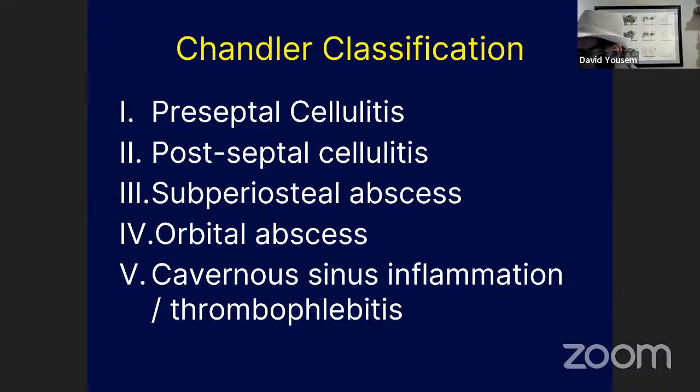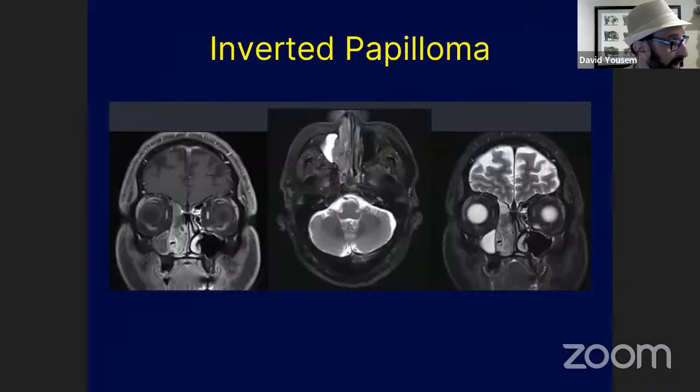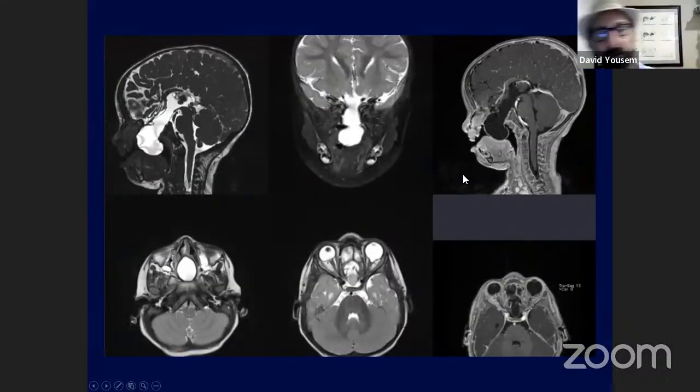So it's pretty rare for us to do a contrast enhanced CT for neoplasms or for suspected intracranial spread of an infection. Can you have orbital subperiosteal abscess without concurrent orbital cellulitis? In general, what you see is the infiltration and edema of the intraconal fat associated with the subperiosteal abscess. So most of the time you get this infiltration of the fat. So it is with concurrent orbital cellulitis, but with the Chandler classification, we would call it grade 3. All right, moving on to the next case.